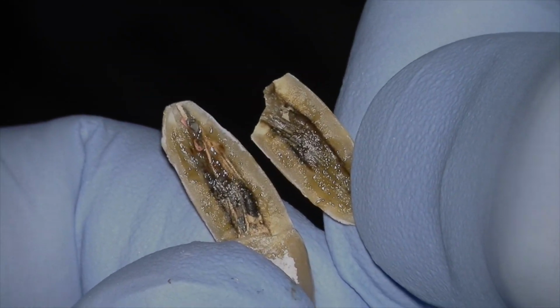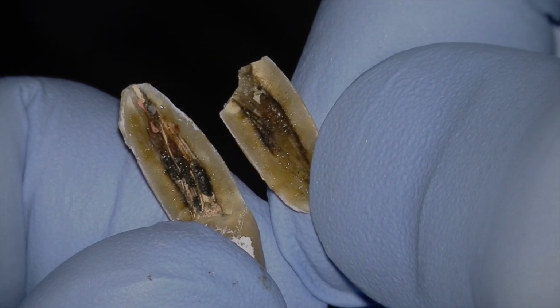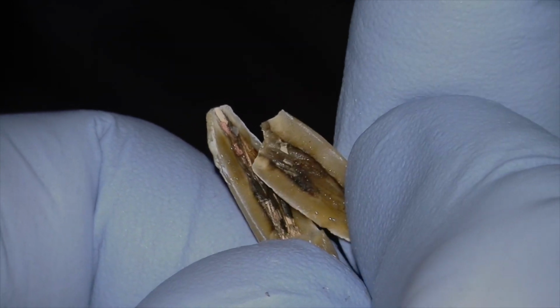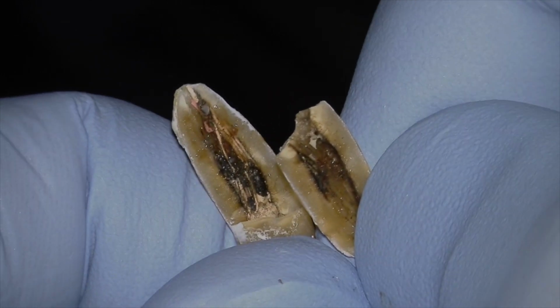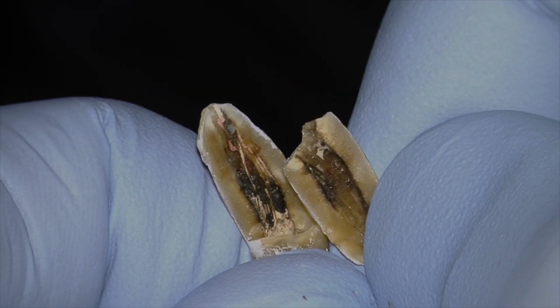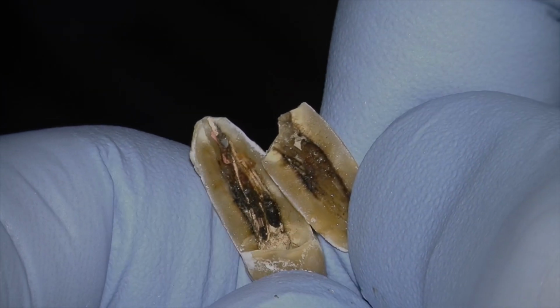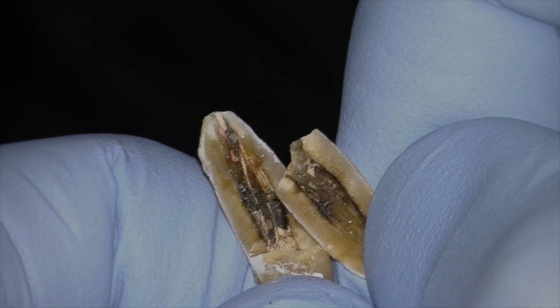And you can tell here, look at all that black stuff in there, but this tooth was obturated using lateral condensation. So probably what happened was condensation forces during the lateral condensation obturation technique slowly built up and probably started to crack. And over 30 years, it propagated and propagated and propagated, and finally it became symptomatic.